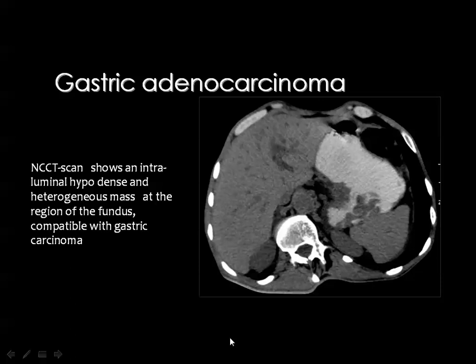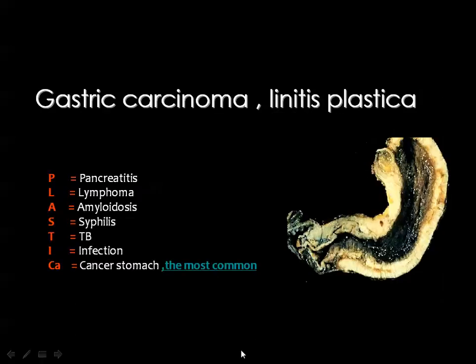And this is a gastric fundus adenocarcinoma infiltrating the fundus of the stomach, and the fundus has been reduced to this narrow tract, and this is the mural part of the tumor, and here also the mural part of the tumor, and you know that this area is near the gastroesophageal junction.